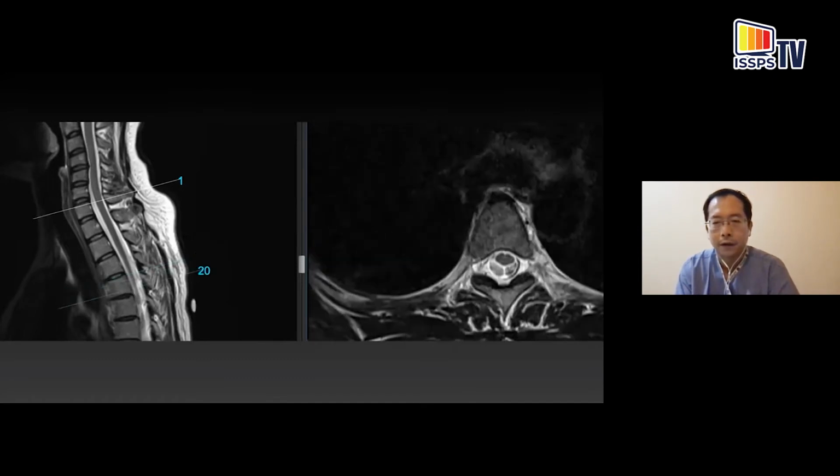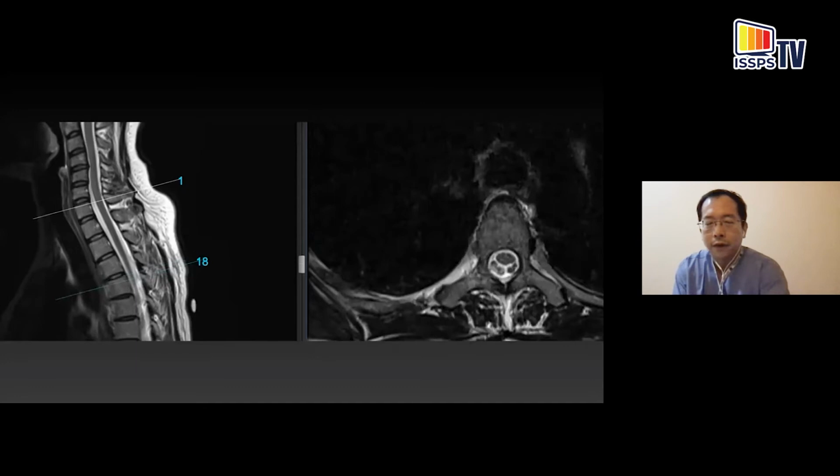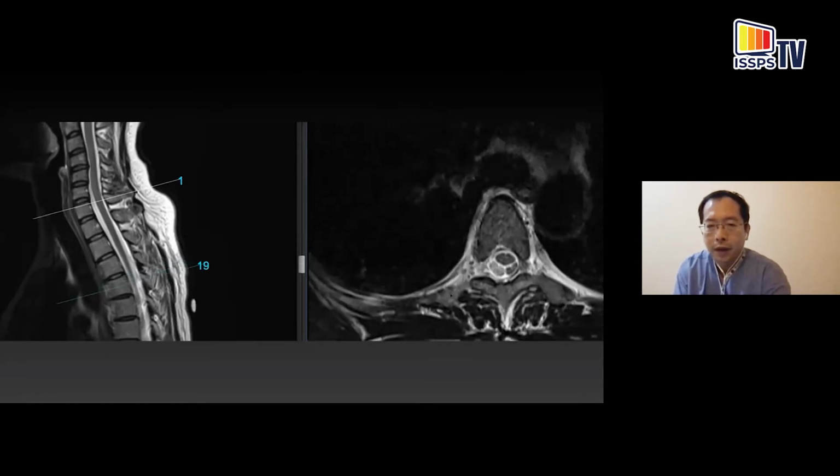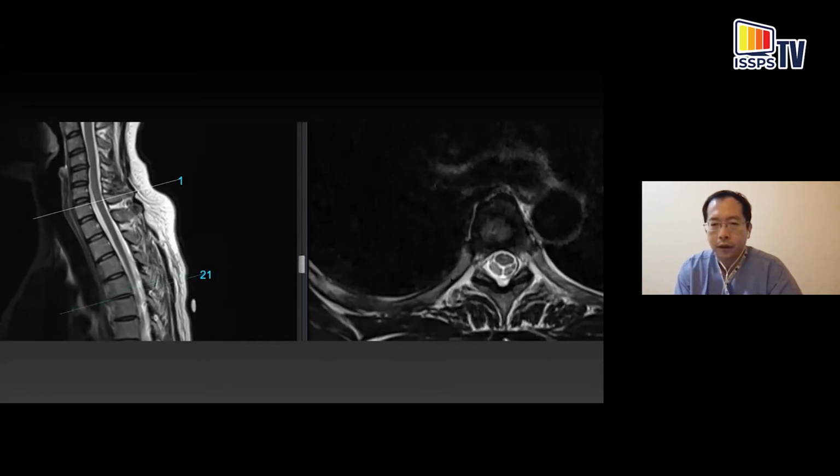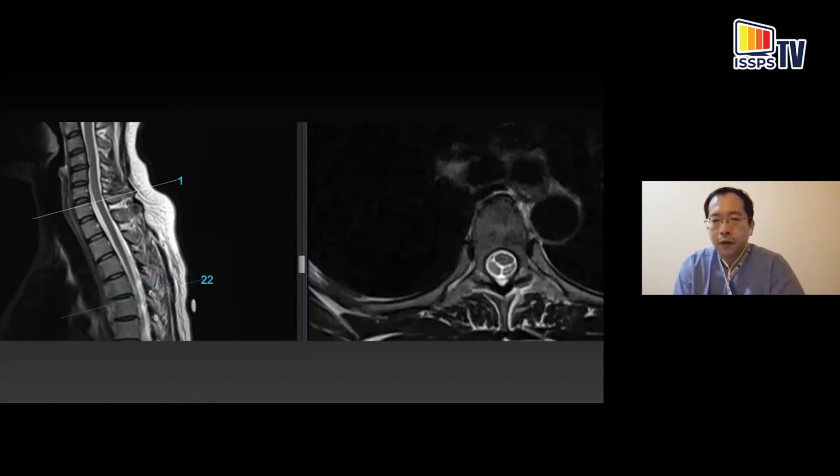This is T4. And coming down, just inferior to the transverse process tip, again, the thoracic paravertebral space with all the vessels in that area. Just about 3 to 5 millimeters below, you're starting to see the top of the rib again. So your angulation needs to be fairly precise. The rib acts a bit as a protection for you if your needle is angulated a bit too inferiorly. So always pull back if you feel the rib.